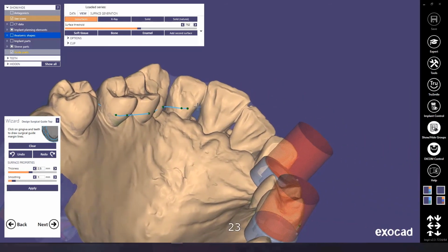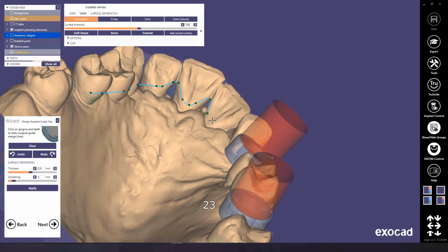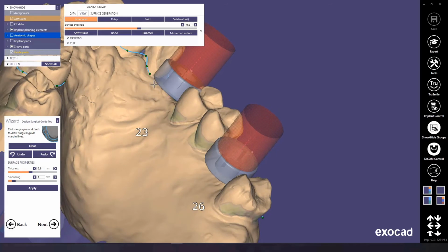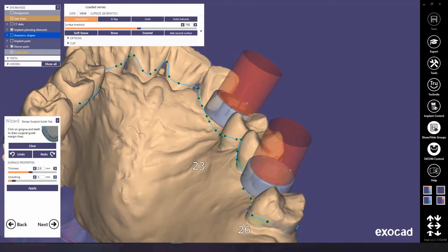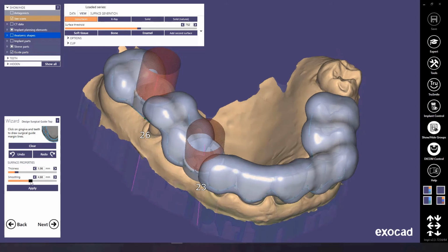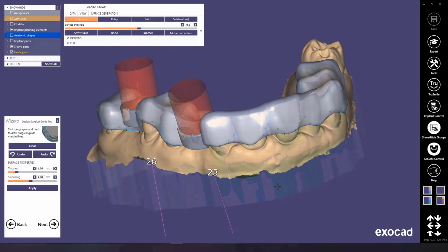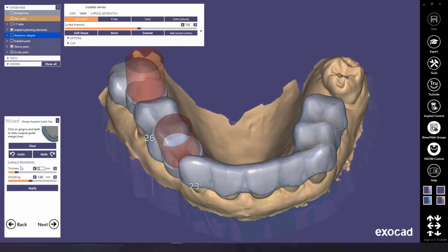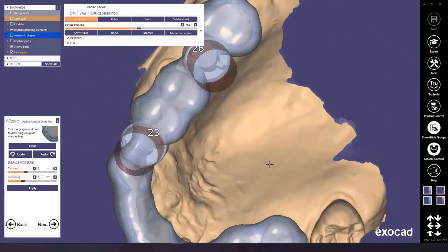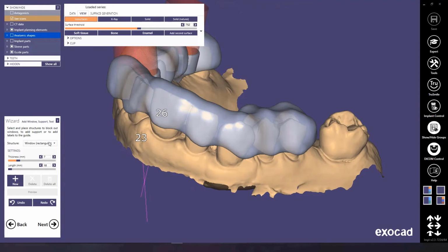As always, in the box on the left, we can set and change our parameters for the design. In this case, we can modify thickness and smoothing of the guide's surface. When we modify a parameter and would like to have a preview of this modification, we can click the button Apply and see the change on the guide we are designing. So we can feel free to try as many changes as we need, trying to find the most adapt values for both parameters. Click Apply again, and then see if the final result we are obtaining is satisfactory enough to confirm and proceed to the next step.